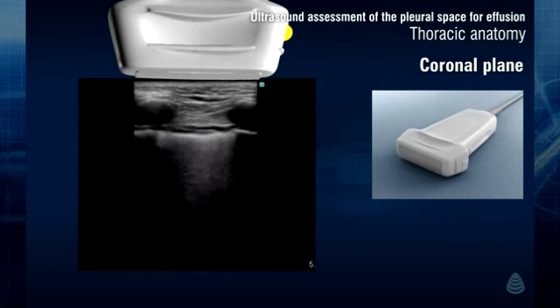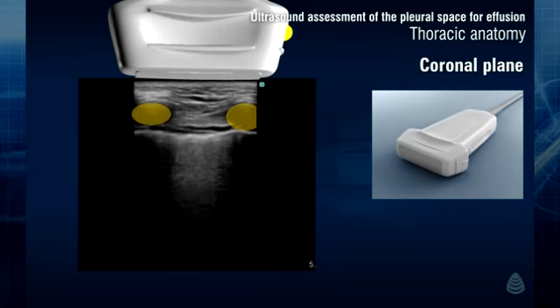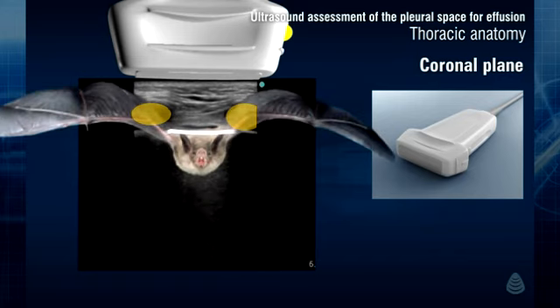The normal alveolar lung parenchyma is filled with air, so that lung is not visible as a direct structural entity with ultrasonography. We can appreciate the pattern made by the ribs and the underlying pleural line, which resembles the contour of the base of the wings and back of a bat, the so-called bat sign.